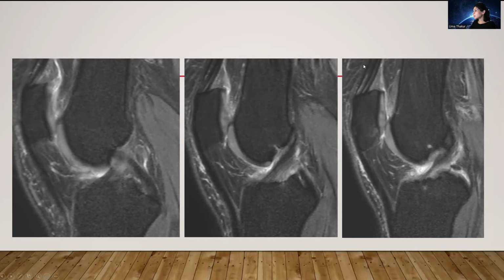It's dark. This quadriceps tendon, this is a normal trilaminar appearance of the quadriceps tendon because it consists of the blending of the rectus femoris and the vastus intermedius and lateralis and medius tendons. Behind it is the retroquadriceps or suprapatellar fat pad, which is now edematous in this case. And posterior to that is the prefemoral fat pad. Between these two fat pads is the suprapatellar recess or pouch, and this is where effusions accumulate.